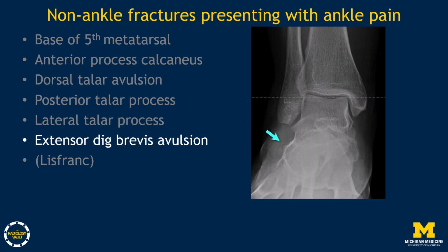Here's another small flake fracture. This one is a result of avulsion of the extensor digitorum brevis origin from the lateral calcaneus.